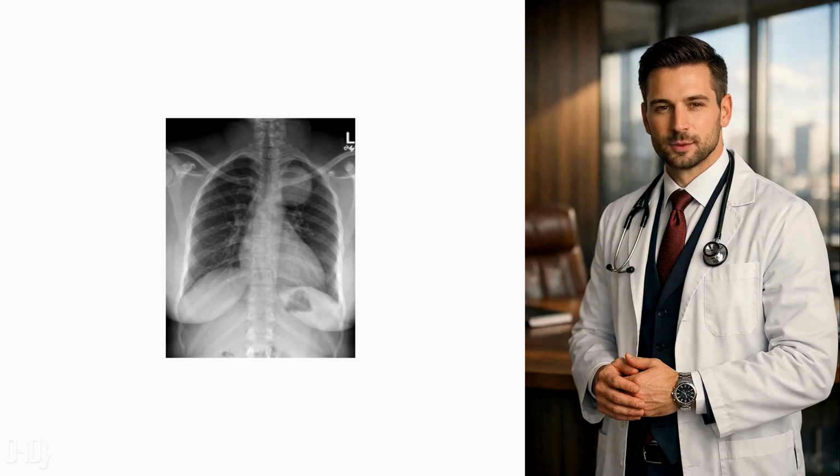A patient walks in with vague chest pain. The X-ray looks almost normal until you notice a shadow behind the heart. Is it benign or something aggressive?